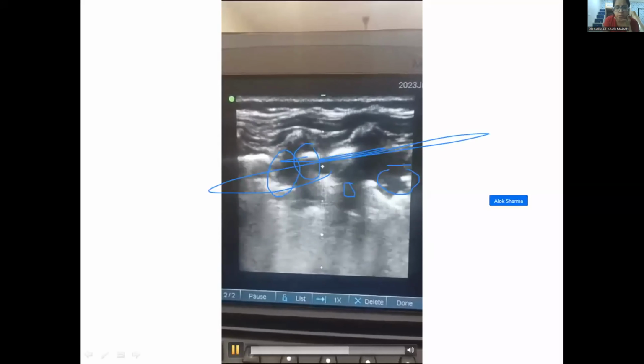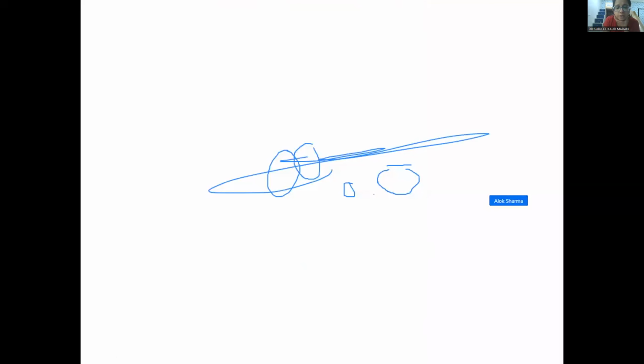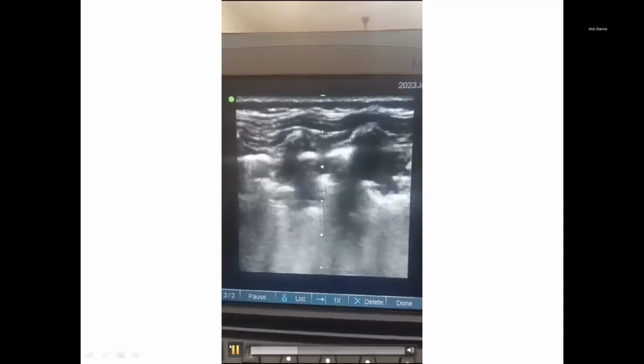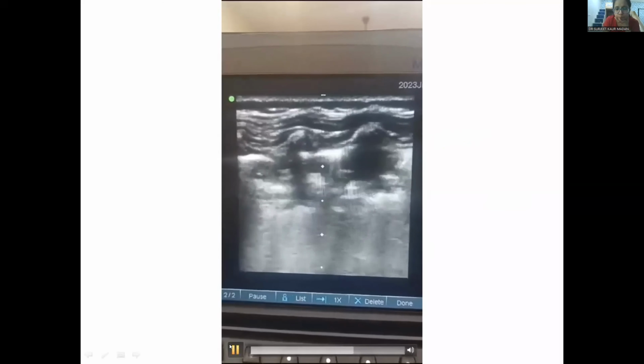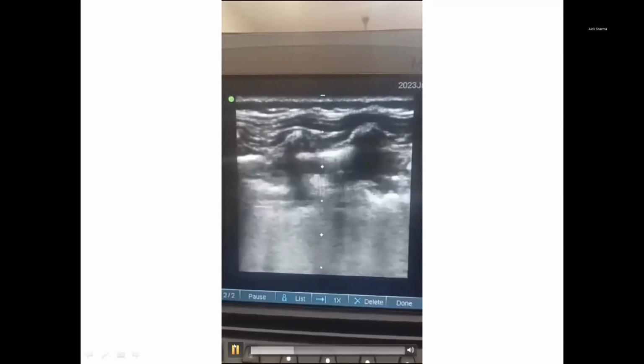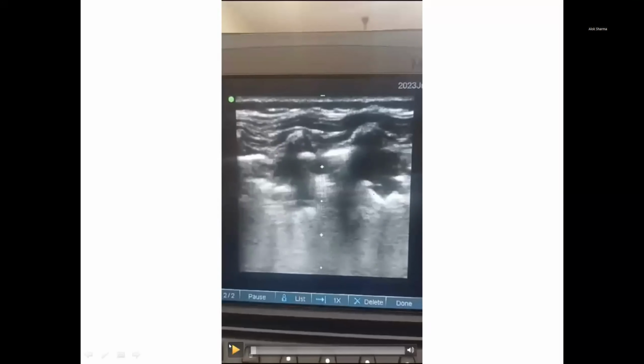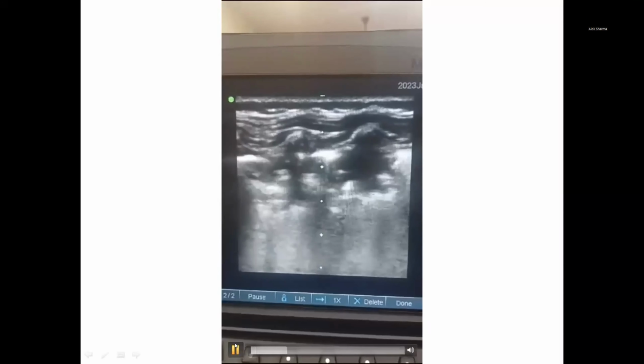We treated this, gave respiratory support and antibiotics, and the baby got better with that. What was the CRP? CRP was also around 75 or something, very suggestive. Did you put Doppler on it? No, I didn't. No problems. The history and everything would suggest that it's a very bad fractal sign. Very nice images.